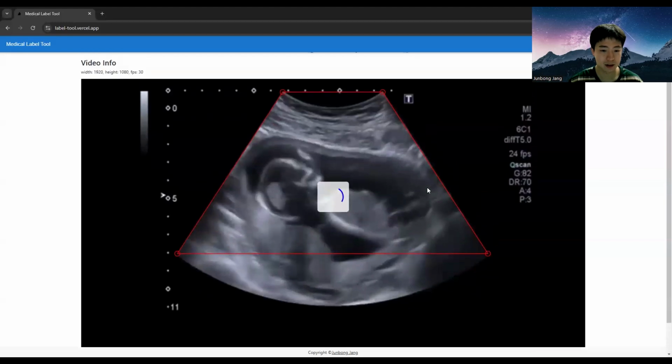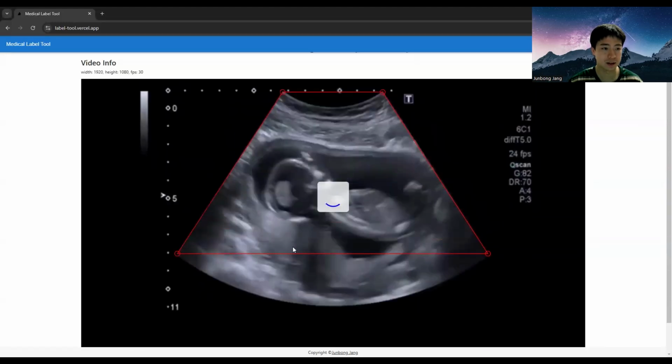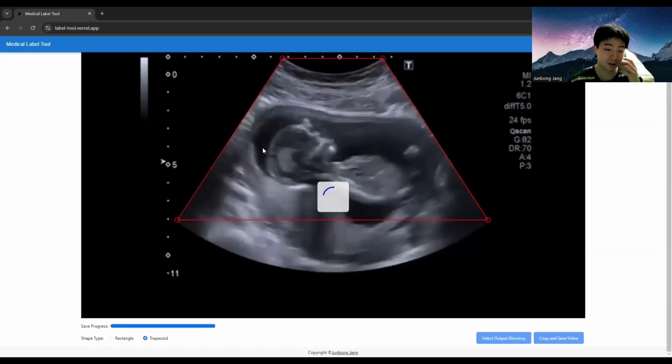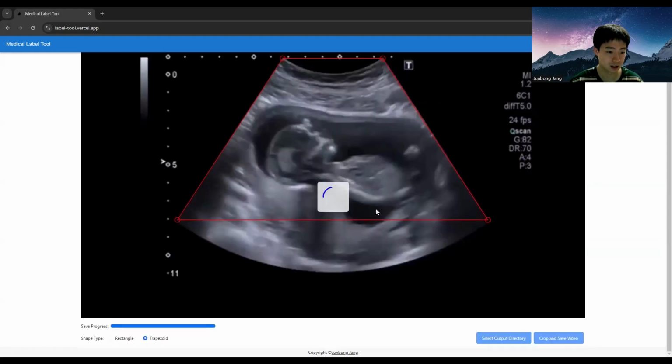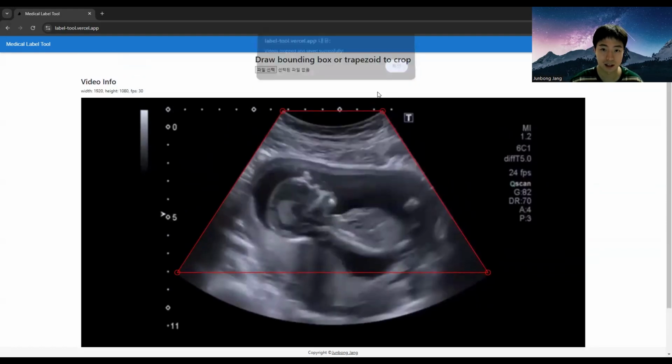It'll be saved soon. By the way, I got all these videos online, which are freely available. But if you want, I can share them. Okay, so it's done. Same video, but look at it, right?